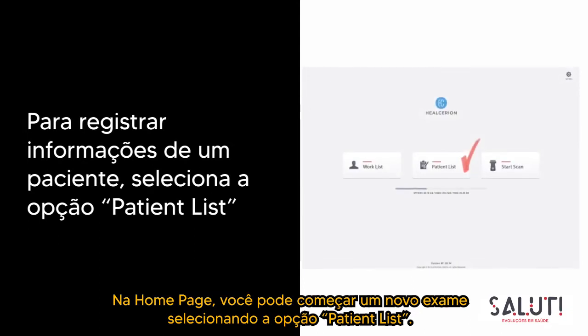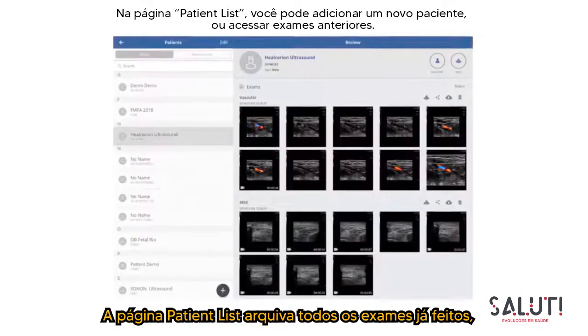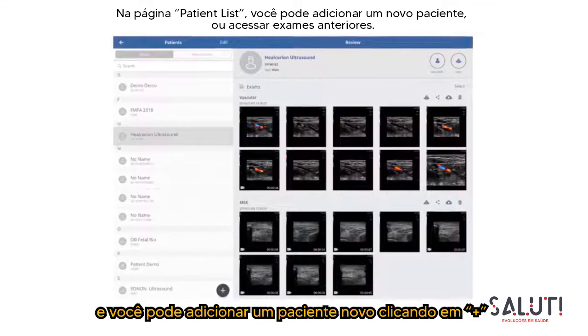From the home page, you can start a new exam by going to Patient List. The Patient List page archives all of the exams you've already done, and you can use the plus sign to create a new patient file.